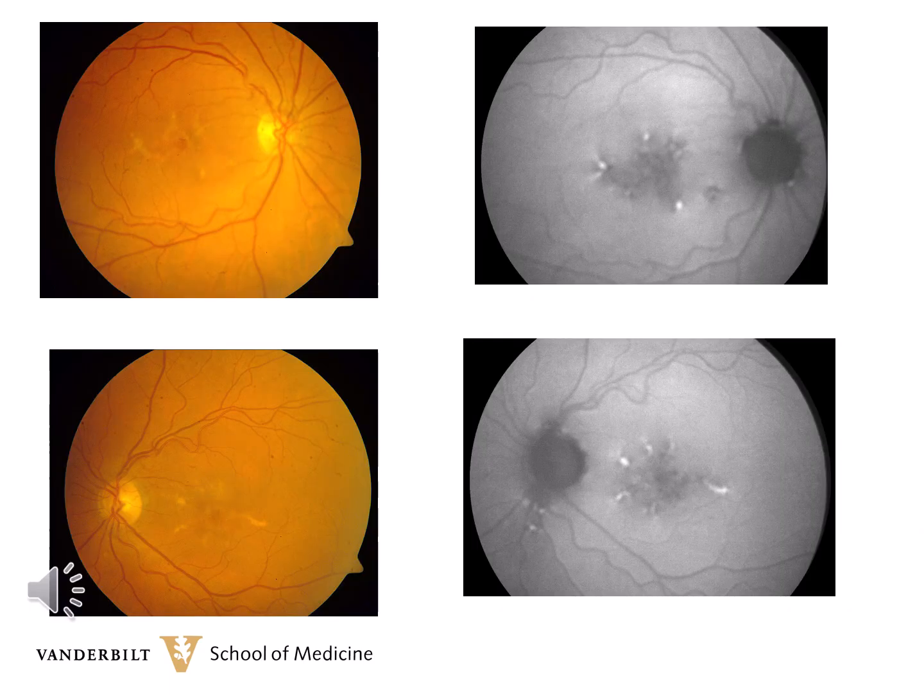August Deutmann first described the butterfly pattern in a family which had an autosomal dominant pattern of inheritance. The macula may have yellow, black, or white radiating patterns like wings of a butterfly. Here is an example of butterfly pattern dystrophy with yellow radiating wings. Fundus autofluorescence shows the hyperautofluorescence, where there's a buildup of lipofuscin in the yellow lesions.